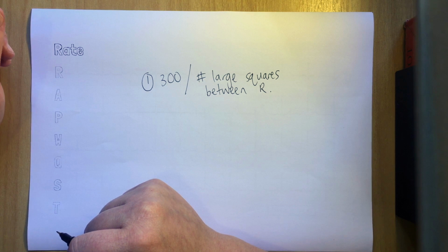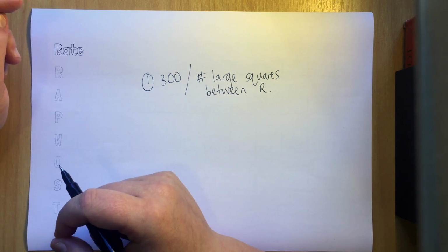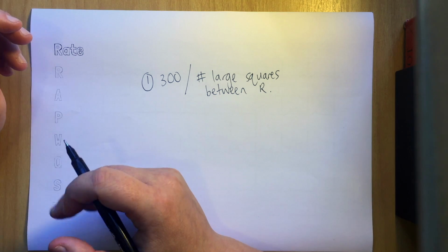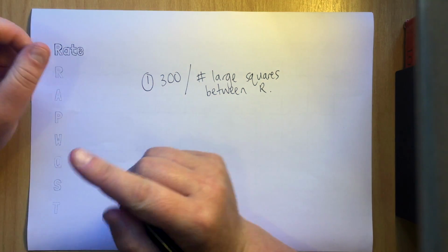A situation when it doesn't perform so well would be when the heart rate is irregular, because if you're only looking at the distance between a single pair of R waves, then you're not necessarily going to get a good feel for how often the heart's beating over a longer time period. It's only really showing you that small time period.